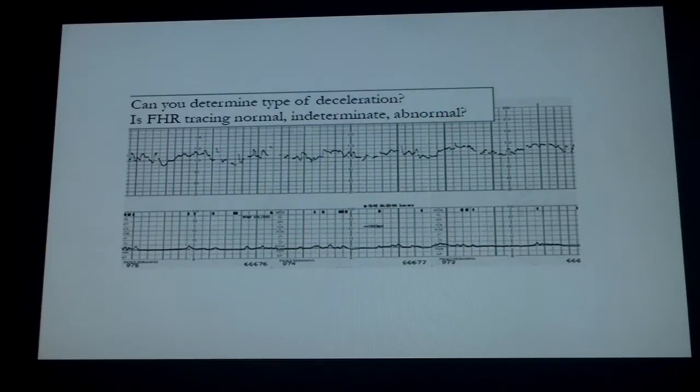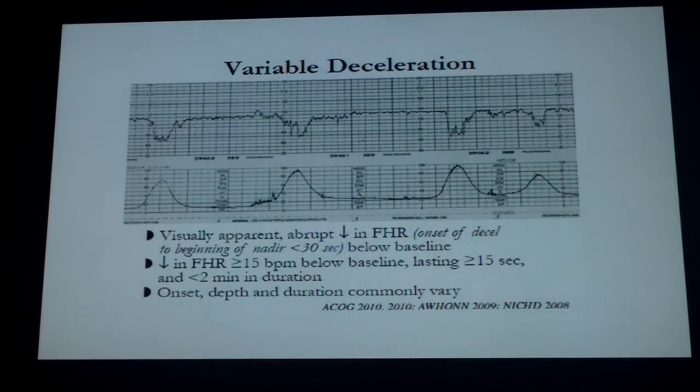determine any baseline. So you would have to say that at that point that strip is indeterminate. Category 2.